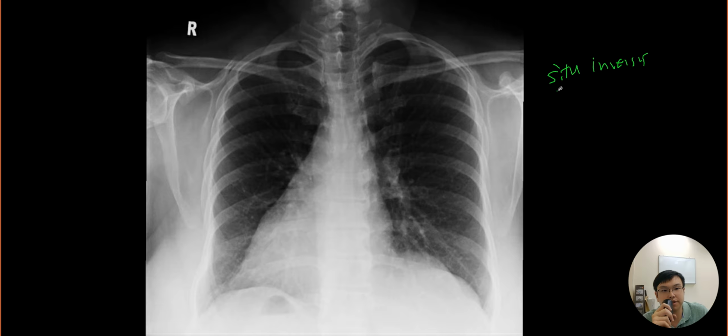Okay, situs inversus. On chest radiograph, we are focusing on two types of situs assessment. One is called the visceral, which we have already done, mainly focusing on the liver as well as the stomach. For the liver, you do not see any bowel loops, and there is a slightly high up hemidiaphragm because of the larger size of the liver, and the stomach bubble in close proximity to the undersurface of that side of the diaphragm.